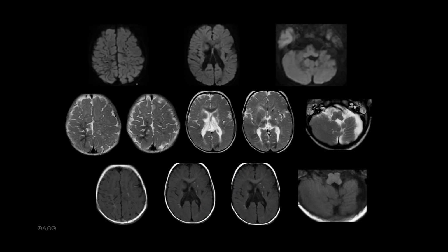Here are the MR images. On top are the diffusion images, no acute changes on the diffusion, but the axial T2 images demonstrate areas of hypointensities along the subcortical region, the bilateral cerebral hemispheres, more along the right parietal region. There are areas of chronic ischemic injuries in the bilateral basal ganglia and thalami. Some areas of hypointensity in the caudate, probably old hemorrhage, and also on the T1 weighted images, you can appreciate these hyperintensities along the bilateral deep nuclei, the periventricular region, and also the subcortical white matter.